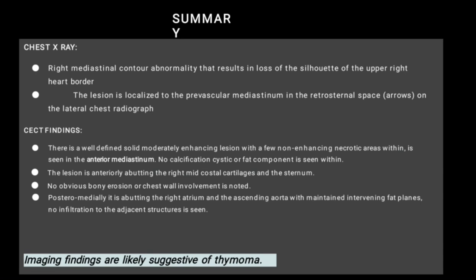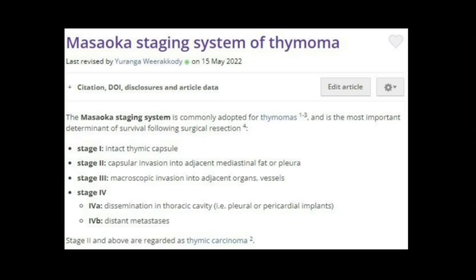And on CECT, it was a well-defined solid moderately enhancing lesion with few non-enhancing necrotic areas. There was no bony erosion, no chest wall involvement, and no infiltration of the adjacent structures. So these features were likely suggestive of a thymoma, a non-invasive thymoma in particular.